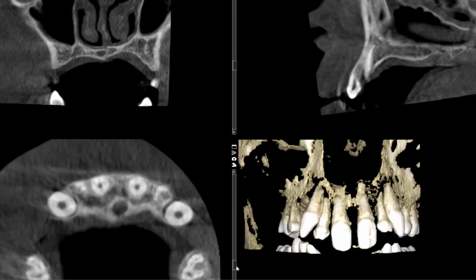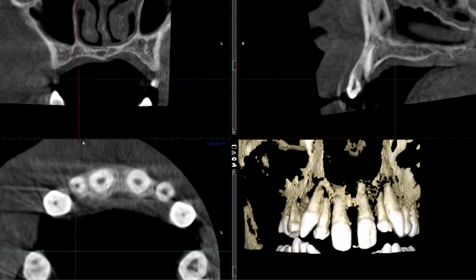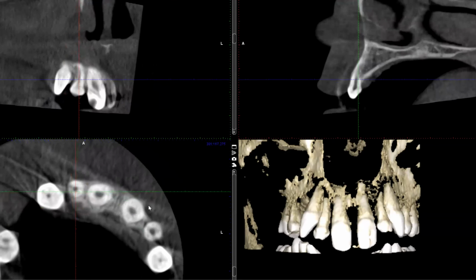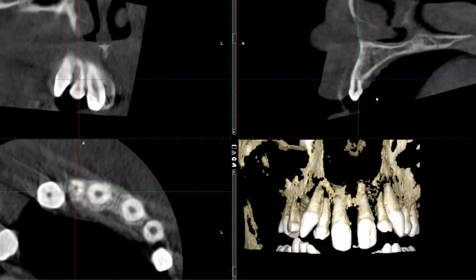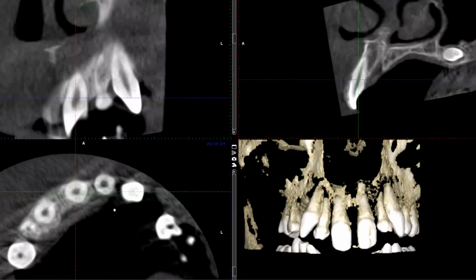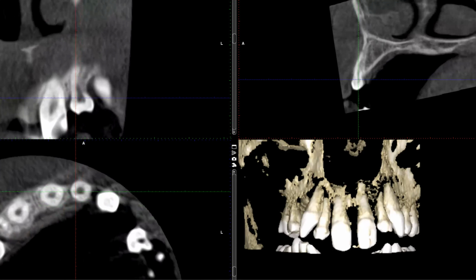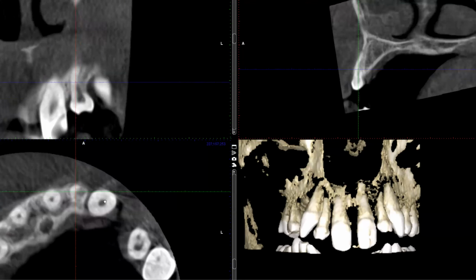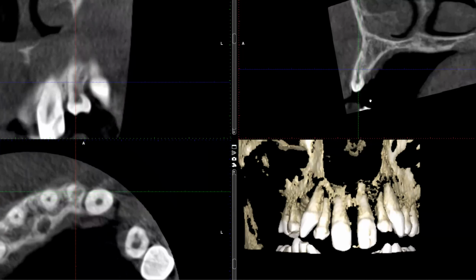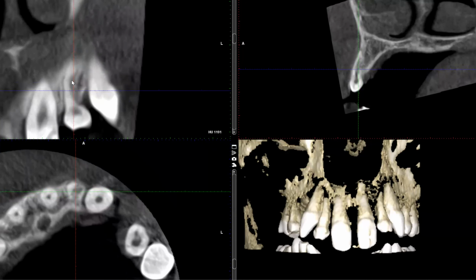These are primary laterals. So let's confirm the extent of resorption of these primary laterals. So right here, the tooth looks almost dilacerated because of the significant resorption that is sustained at the distal aspect. And if we look at the other side as well, it once again looks dilacerated because all of that is simply resorption.